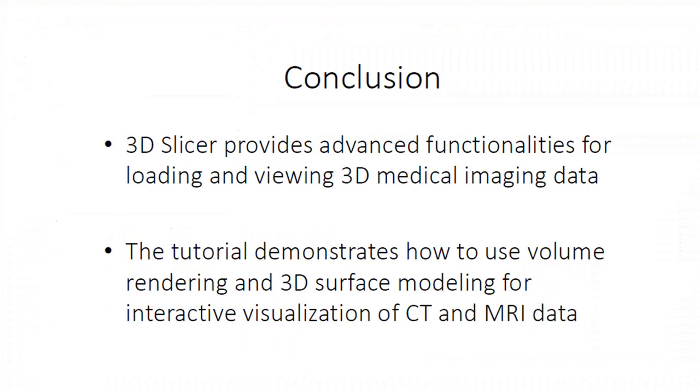Conclusion. 3D Slicer provides advanced functionalities for loading and viewing 3D medical imaging data. The tutorial demonstrates how to use volume rendering and 3D surface modeling for interactive visualization of CT and MRI data.